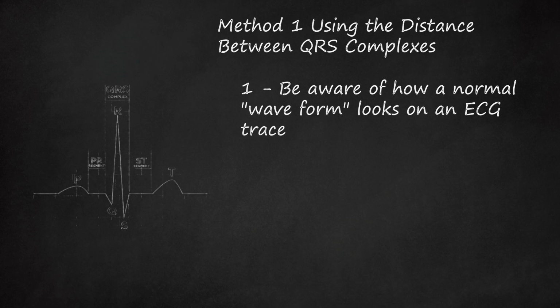The P wave is a small semi-circular shape located right before the tall QRS complex. It represents the electrical activity of the atria, atrial depolarization, which are the two small chambers located at the top of the heart. The QRS complex is the tallest, most visible aspect of the ECG trace. It is usually pointy, like a tall, thin triangle, and very easy to recognize. It represents the electrical activity of the ventricles, ventricular depolarization, which are the two large chambers located at the bottom of the heart that forcefully pump blood throughout the body.